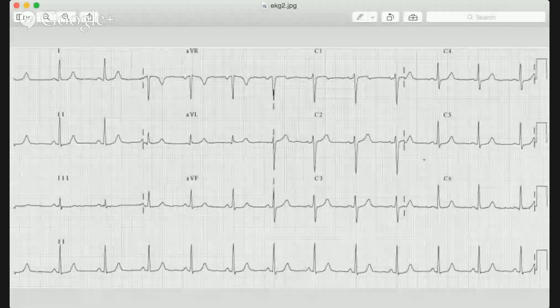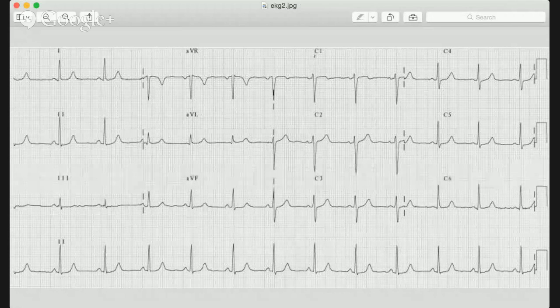Do you see this EKG on your screen, Mr. Vickers? I do. All right. This is what you call a 12-lead EKG. For all purposes here, where you see C1 through 6, we're going to act like those are V1 through 6, okay? Sounds good.